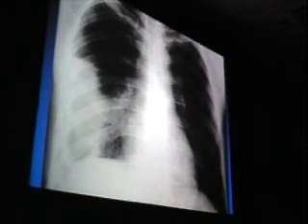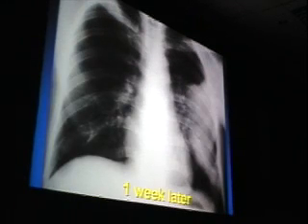So another patient with a peripheral airspace opacity. Interesting. We might, again, go through our differential. I won't bore you with that. Interesting thing about this case, the patient untreated came back 1 week later and now has completely resolved the right-sided opacity and has a new peripheral left-sided opacity.